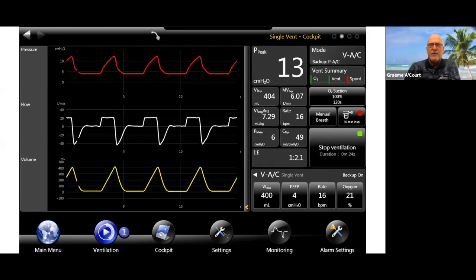So on the Bellavista, this is called the cockpit, right? This is purely like you're in the aircraft, right? You've got some information in front of you, some basic settings. Okay, what am I looking at? I don't want to be flooded with too much information.